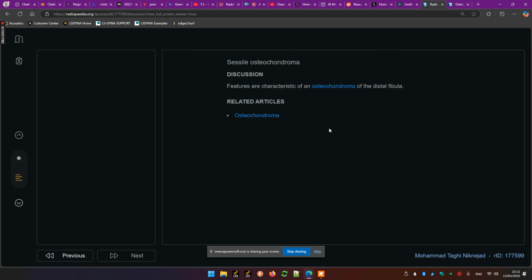Osteochondroma is usually benign, and can undergo transformation to malignancy in 1% when it's solitary. Usually in the lower limbs, you saw that it grows with a stalk, usually in the direction away from the adjacent joint. It stops growing after puberty. Usually it grows around the growth plate.